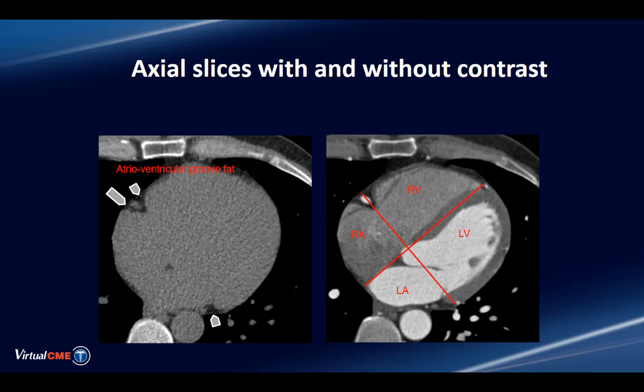Almost always, unless the heart is particularly squished or deformed by chest abnormalities or chamber enlargement from a shunt, this orientation of the coronary arteries is very faithfully preserved in a surprising number, actually the majority, of cases. You'll begin to appreciate this as you go ahead and manipulate the image yourselves.